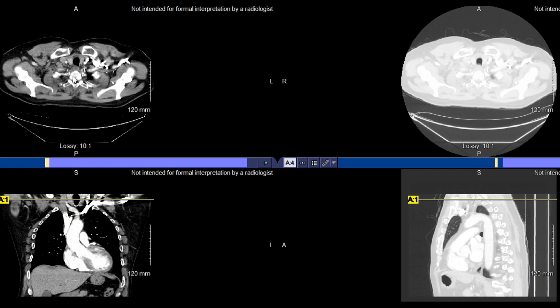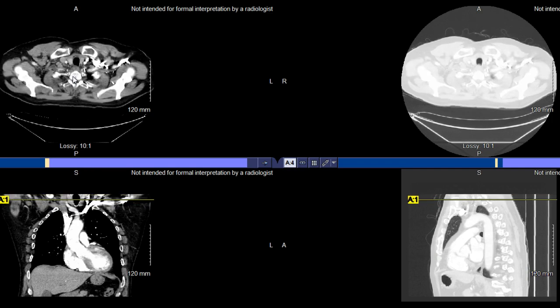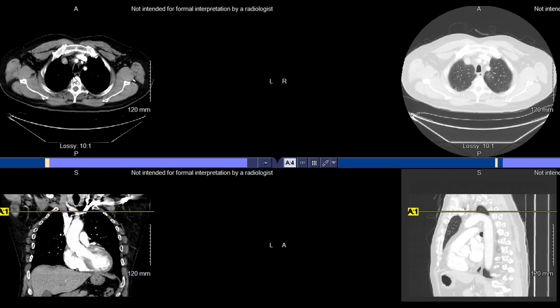So another point of emphasis of this basic tutorial is just to look at the vascular based structures. So I'm going to look at essentially one or two structures at a time. So one of those structures that I want to start off with, we're going to go with some structures that you know here. So looking at this basic slice, you can see basically 5 structures here. So 1, 2, 3, 4, and 5. So these structures here are referred to as the veins. So these are the brachiocephalic veins, respectively named based on their side. So here's the right brachiocephalic vein and the left brachiocephalic vein.